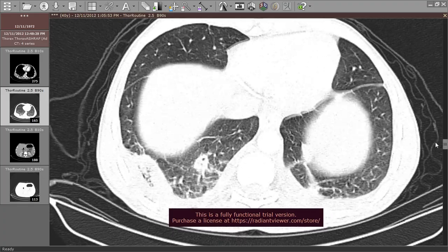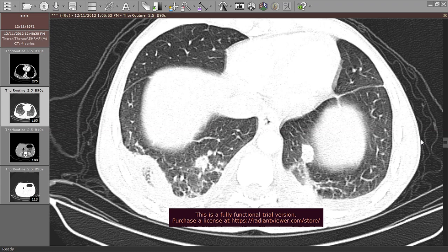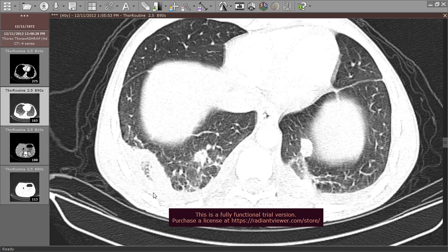I need you to notice this finding as well. This is a subpleural wedge-shaped pathology with central ground glass opacity and peripheral organizing material. This is what's called the Atoll sign. With the Atoll sign in a subpleural location with a wedge-shaped appearance in such patients, the most important and first prime diagnosis will be pulmonary infarction. So the Atoll sign here represents an infarction.